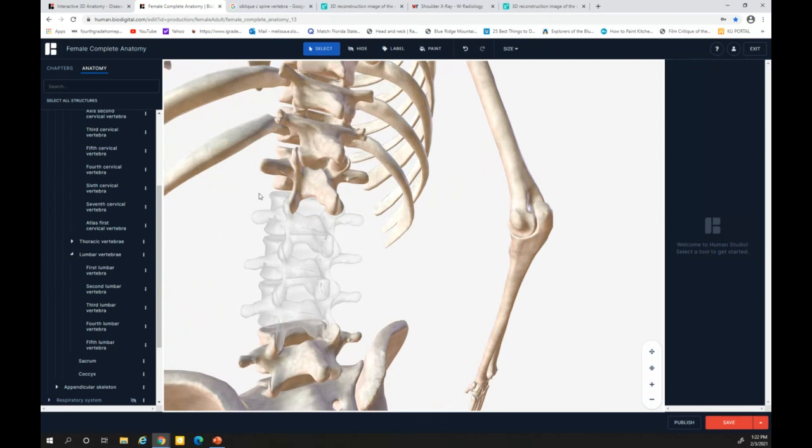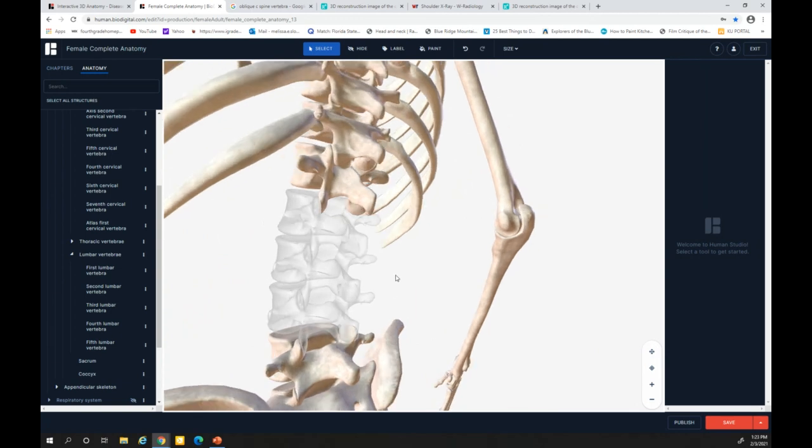Right, so we can follow the dog here. But remember, we have to flip this and look at it as if it's an LPO. Even though we took it like this, we're going to flip the image, and this little guy is going to be pointing towards the left when we look at the actual x-ray. So it's going to look just like the LPO.